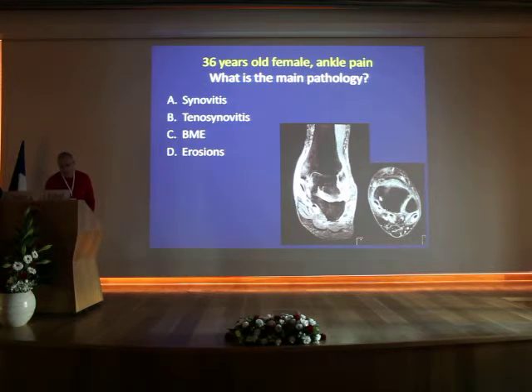Let's look at the axial, around the medial side tendons. You see here edema and enhancement. Okay, you can see the same thing surrounding the ligaments here, and also the tendons here, and you can see it also here. So what do we have here? The joints themselves look quite fine. No, not subtalar. Sorry, subtalar joint here. This is more like, no, sinus tarsi, there is a lot of synovium there.